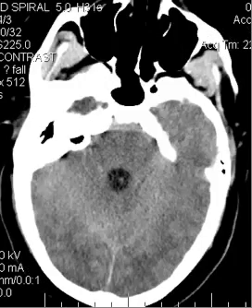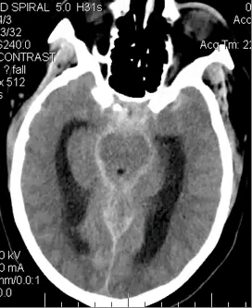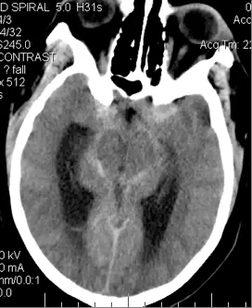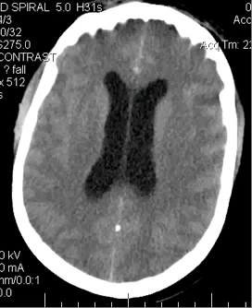What I want to also point out here is look at the size of the lateral ventricles, and then compare them with what you see of the sulci. The lateral ventricles are prominent, fairly large, moderately large at least, and the sulci are completely effaced. So this is not the baseline level of these ventricles. They're usually smaller. In other words, if this were the state of the patient's ventricles normally, you would not expect a 50-year-old to have cortical sulci that are completely effaced. You would be able to see the cortical sulci.